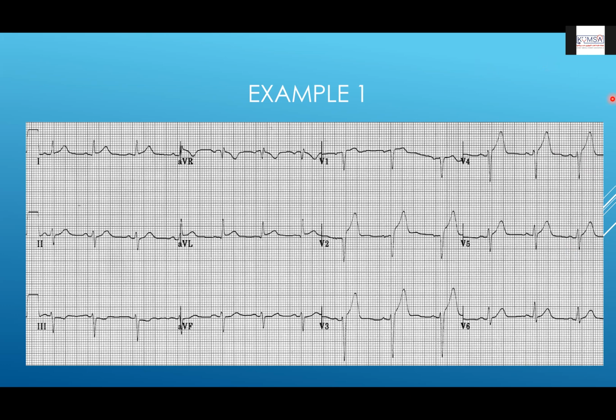So what are you looking at? So I can see ST elevation specifically in leads V2, 3, 4, and possibly V5 and V6. So I think this is an anterolateral STEMI.